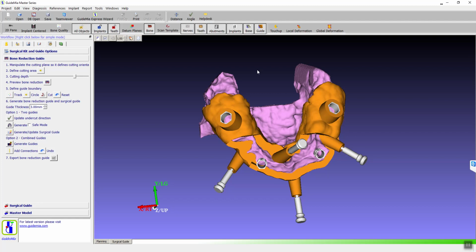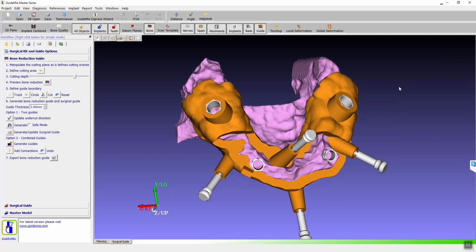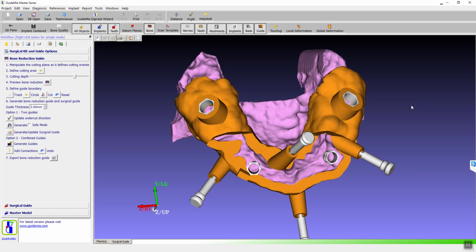Yeah, I'm going to want to print one of these. Obviously, it looks like two of the anchor pins are not in the best place for this. Yeah, if you want to print, you probably want to adjust the design. Is there any Mac version? There is no Mac version, but I do have a license for you for the software. Okay, I've got to talk to them. We just have to have IT install it for you because we don't have administrative privilege. Neither do I.